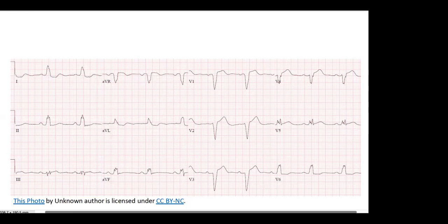And what is the main pathology on this ECG here? I mean, it's self-explanatory. What would you say? Is it a right bundle branch block, or is it a left bundle branch block? And from all that you have seen, would you please make your argument and tell us it's either right or it's a left blockage?